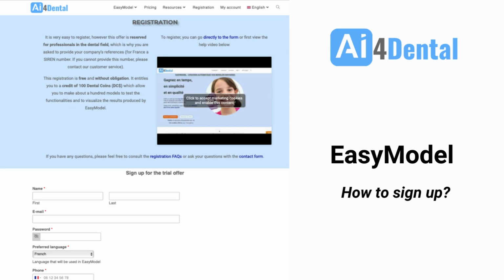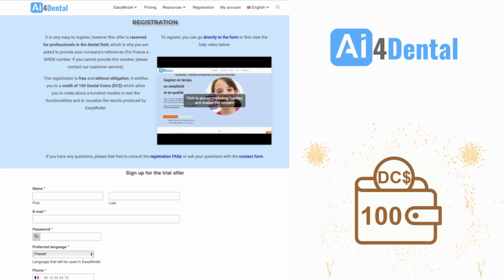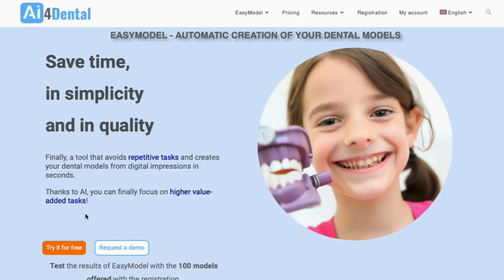Hello, let's see together the registration process of the AI for Dental website, which will allow you to try EasyModel, free of charge and without any commitment. I remind you that with this registration, you will receive a batch of 100 dental coins, which will allow you to make 100 models to test all the possibilities of this new tool based on artificial intelligence.